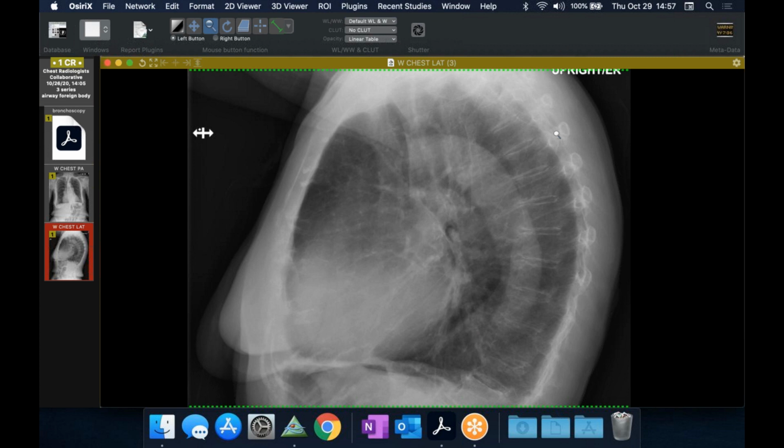Typically, they know about that. So, for example, let's say you saw that, and you also saw that they had placed a left ventricular impeller device, then you can suggest even more that it's ECMO-associated left ventricular failure, because they want to decompress that left ventricle with the impeller device.